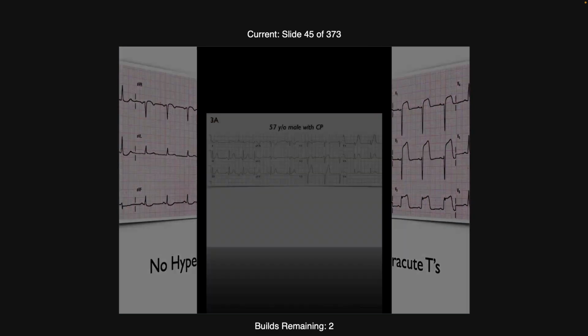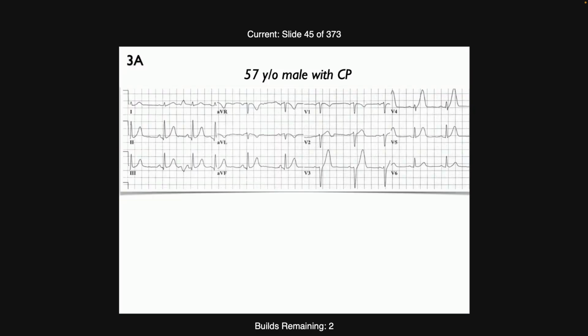Okay, Cody, number 3, please. I see it in V4 and potentially in V5. Okay, excellent. And yeah, I agree with both of those. And what's the criteria you're using, the old, the new, or both? That it fits inside. Yeah, and also V4 fits both criteria.